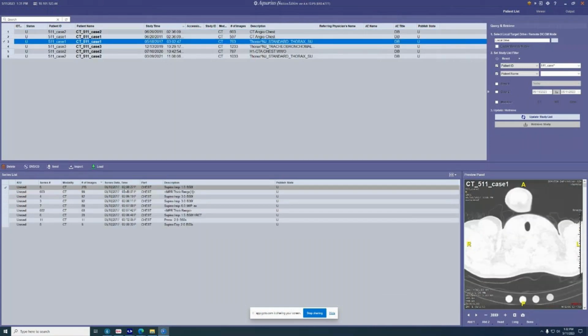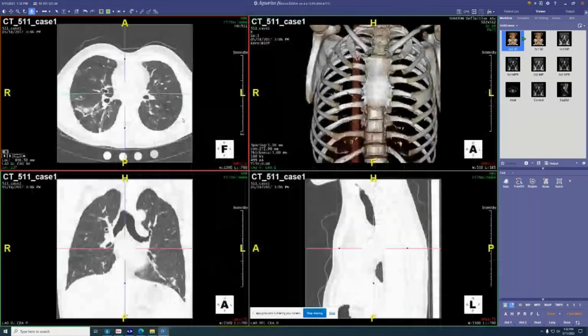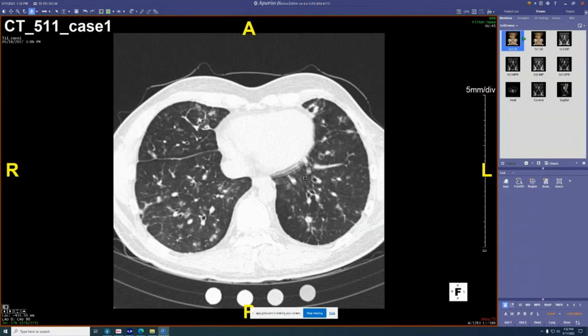I'll show you the spleen in a second, because I guess CVID can be associated with this. So he does have a massive spleen. Well, not massive, just big. Only partially imaged there, but on the abdominal studies, it's imaged.